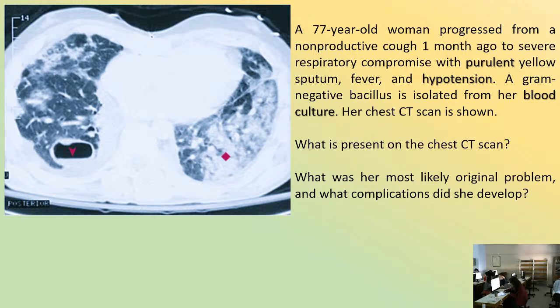There is the central part of the cavity, which is filled with pus, and then we have a zone of neutrophils, but we can't see their nuclei, because within the pus we just see nuclear dust. That means destroyed parts of the nuclei, not whole nuclei. They are not viable neutrophils, those that are there in the pus, in the cavity.